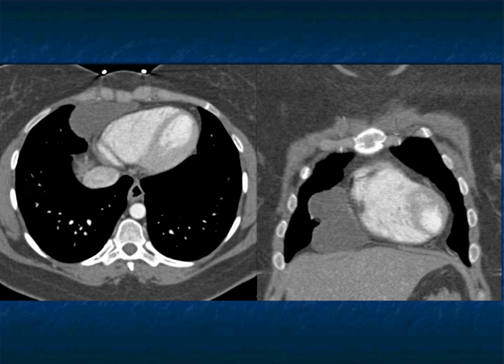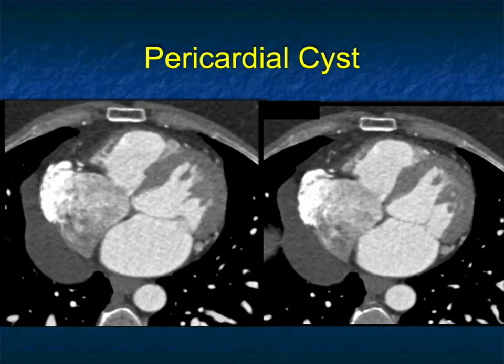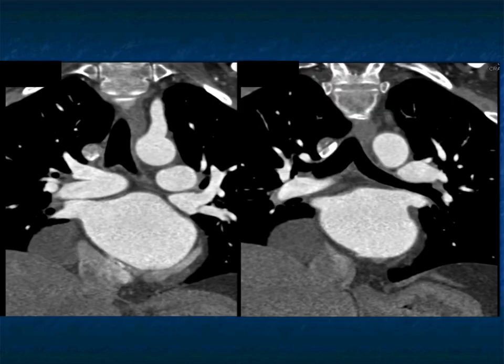Bronchogenic cysts are on the right side and typically don't extend to the level of the diaphragm. Here's another one on the right side. Water density, pericardial cyst. Again, what's important, you don't need to work these lesions up further. They're leave-alone lesions. The coronal view makes the diagnosis even easier as it goes to the diaphragm and is water density.